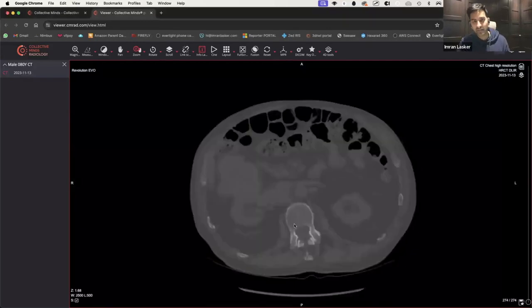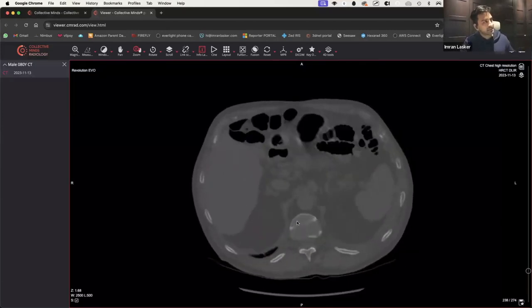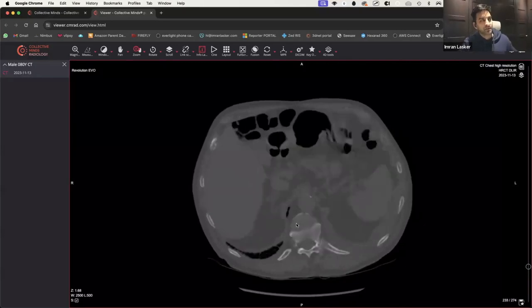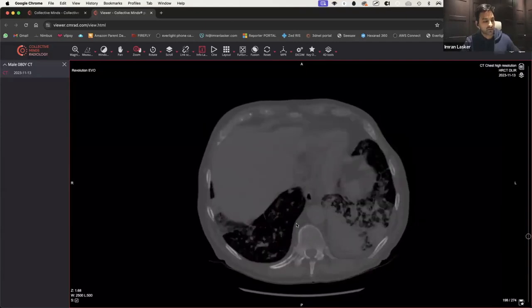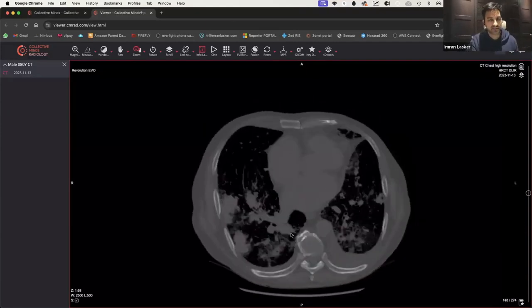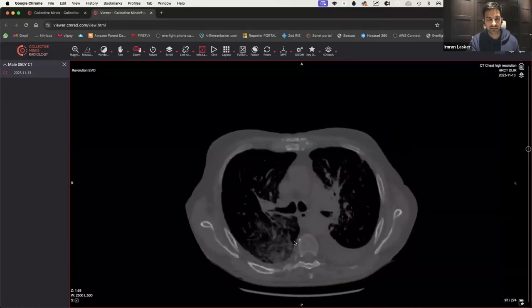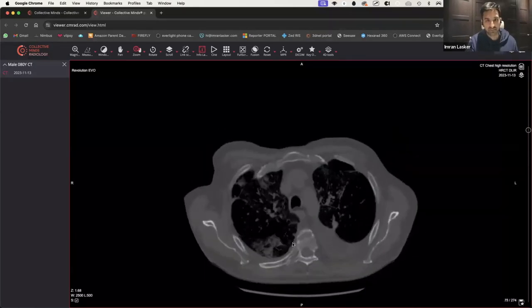And then you've got to be a bit more careful now, because it could be a couple of things, right? You could have multiple pulmonary metastases on a background. No, you could have pulmonary infection, so you could have consolidation and infection on a background of metastatic disease. That's entirely possible. But because we've seen that primary lesion located within the kidney, that's when you've got to start worrying that these are potentially multiple metastases.